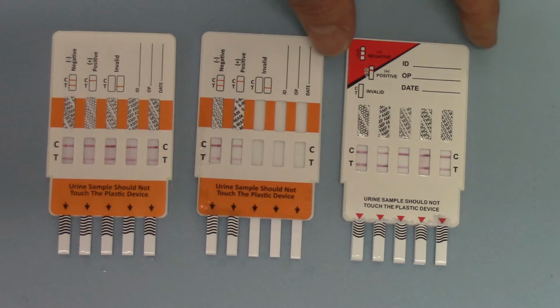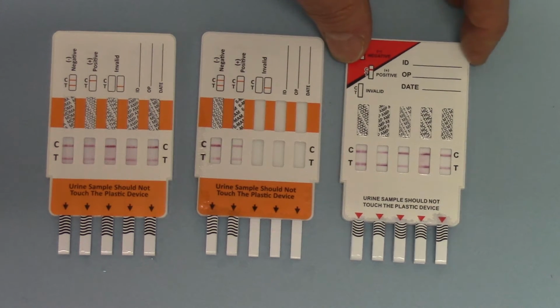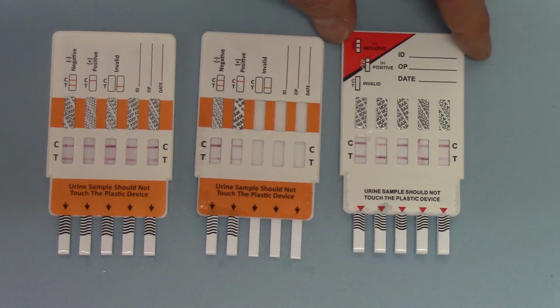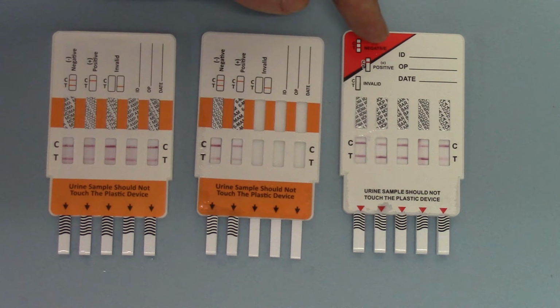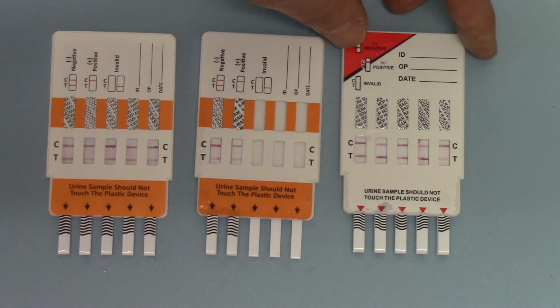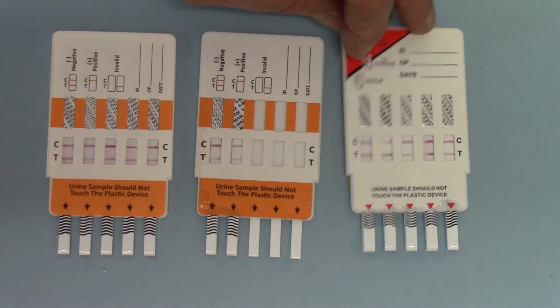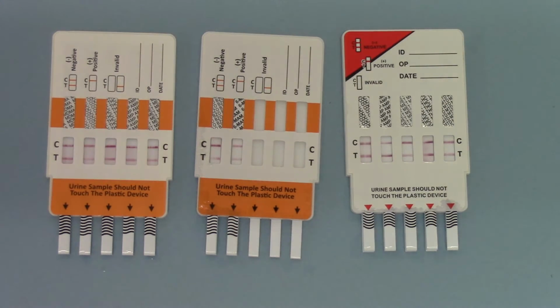If we then move to the 10 panel, you'll see you've got 5 negative results on this side and 5 negative results on the reverse. This particular 10 panel screens for MDMA, MOP, which is a 300 nanogram opiate screen, BAR is barbiturates, BZO benzodiazepines, TCA are the old-fashioned tricyclic antidepressant group of drugs, and on the reverse you've got COC for cocaine, AMP for amphetamine, MET for methamphetamine, THC for cannabinoids, and MTD for methadone.